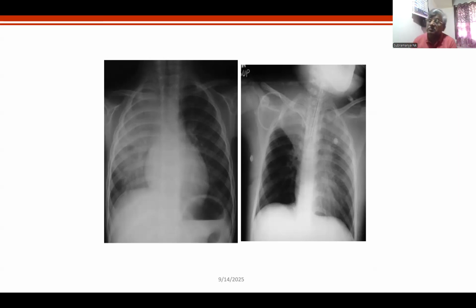That is number 2. Number 3, most important is, what about the middle lobe? There is a compensatory hyperinflation of the middle lobe. Why do I say middle lobe hyperinflation? Look at the distance between the ribs on the right side and the distance between the ribs on the left side. Do you agree on hyperinflation? And look at the radiodensity, more lucent, less lucent. Did you understand? Do you agree with hyperinflation? Please type AG.